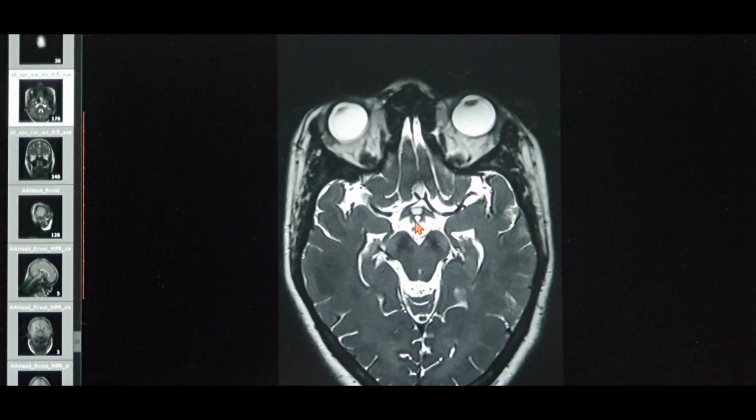See, on the MRI scan, if the patient is having a T1, the artery will look like a flow void over here, like an empty black vessel. If it's a T2, same. If you think that when the patient undergoes contrast enhancement the artery will brighten up or illuminate, no, it is not like that. Now there are two things in that.